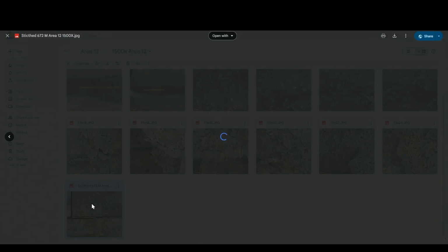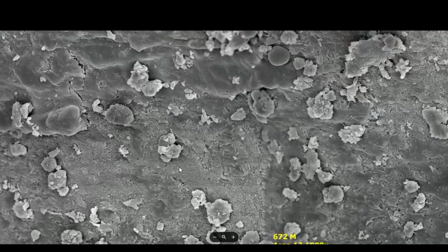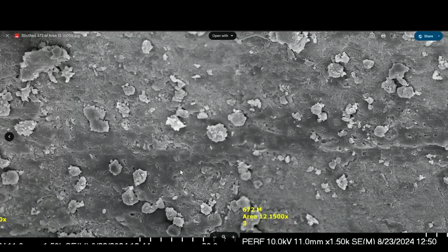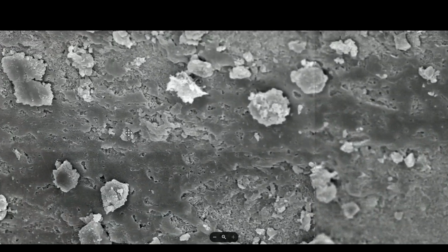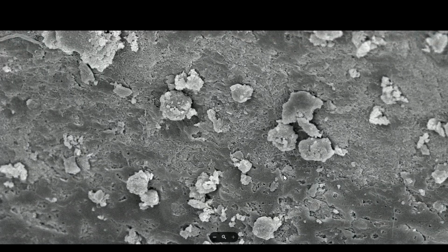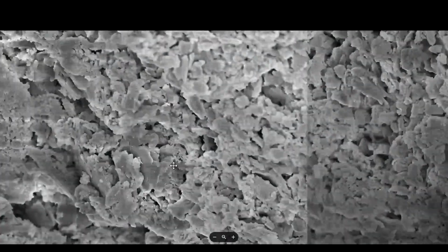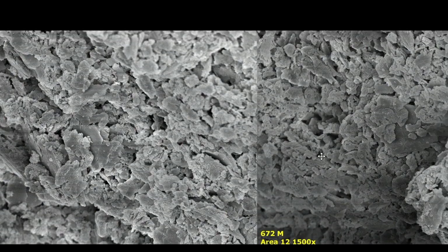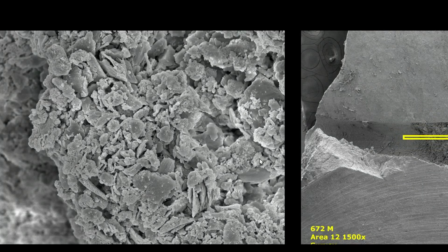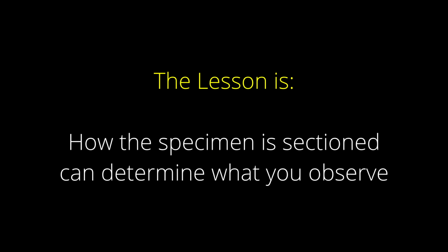And here you can see this looks like that area was instrumented, so there is a smear layer present. As you go through these sections on the site, it's worthwhile really taking a look at these. So there's been some demineralization on the instrumented part of the canal. It looks quite a bit different from the top canal that didn't have any instrumentation done to it, apparently. And now we're in where the debris was from the sectioning disc, and now you get a sense for just how much debris is present from the sectioning.